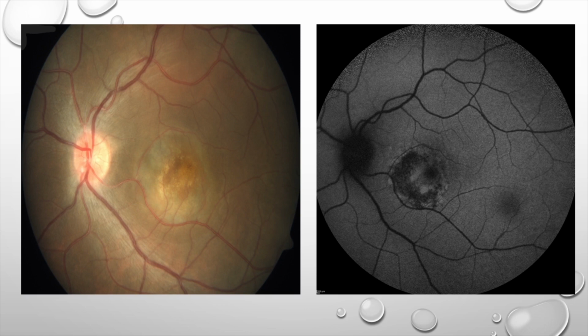So the grayish region around looks elevated. Okay, the next person. So the curvature of the vessels and the gray area that we're seeing around that area. As you see, look below the lesion. It gives you a clue. Raised. Next person. So what makes you feel that there is a difference in the picture? See, it's a two-dimensional picture, very much agreed. That is a wonderful point. But the most important thing is when you see the vessels, the superior and the inferior, you definitely see there is a difference, isn't it?